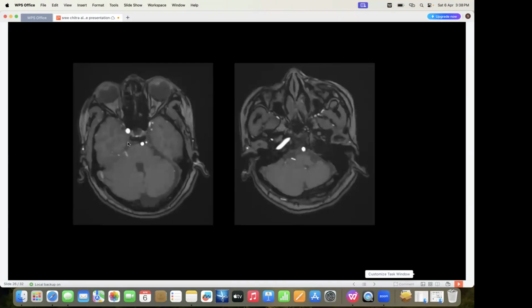After these findings we made out in the plain study, we did an angio, where it was also confirmed that the left ICA is completely hypoplastic or aplastic or occluded. Then we did the CT also. In the CT there was no carotid canal, or a very small hypoplastic carotid canal. The carotid canal is also not seen in the CT, which confirms that it's not an occlusion, it is a hypoplasia or aplasia of the left ICA.